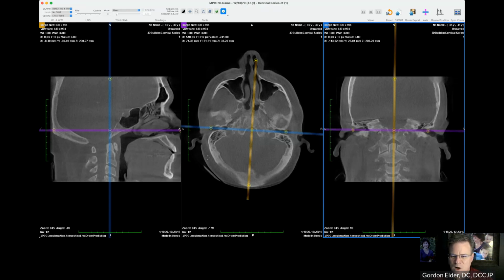either way, this is going to work well with the Blair adjustment. So the first thing I did was line up my line so I can take some measurements. Now, the first thing we do in the Blair system is we look at the atlas. We want to analyze the angle that the atlanto-occipital joints are angled in at. So in other words, they're sitting like this in you, but they're angled inward. So when you're looking at it from top down or bottom up, they're angled in, and these are ellipsoidal joints.